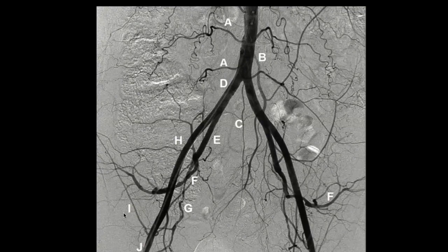So what is this one then? Where do you think this is going? Imagine you've got the bony pelvis here. What bone is it going to? Iliac. The I kind of helps you. Yes. So what is this? Iliac crest. Okay, so this artery also begins with an I. So it's the circumflex iliac artery. Okay. All right. So what are we left with?